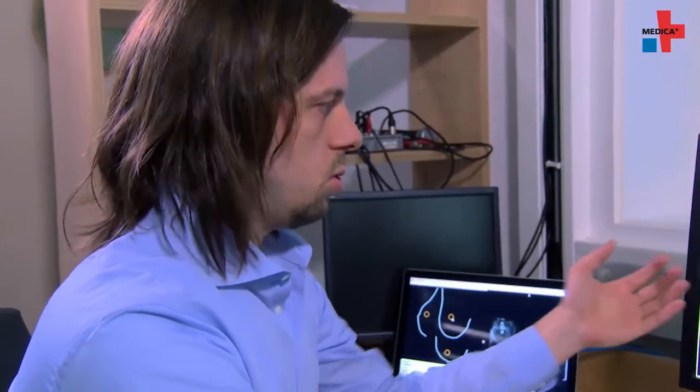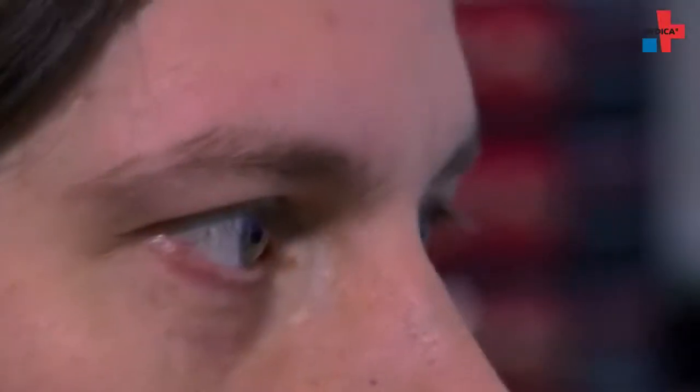What concrete advantage does this provide the physician? The physician no longer has to consider this complex breast deformity. Prior to this, he needed to mentally transfer the location from the images in his head to the other image. This is now done by the software. He also no longer needs to scroll through big amounts of three-dimensional data of the layers. Of course, another advantage is that reporting is made easier with our solution.